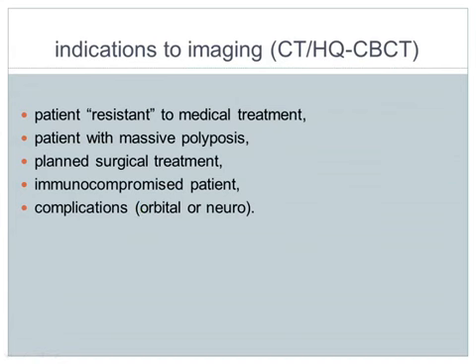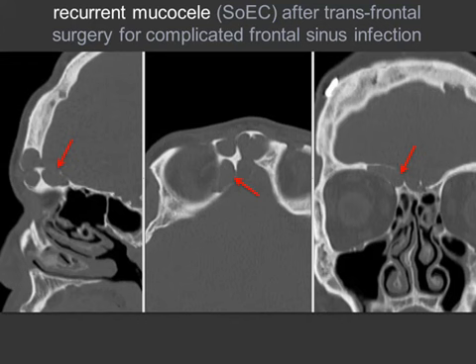And of course, it is very important in the immunocompromised patient, or when assessing the grade of complications like in acute rhinosinusitis. This is a patient who had already been treated because of a situation that at the end resulted in infection of the frontal sinus. As you can see, looking at the different profile in the frontal sinus and frontal bone of this patient, the approach was an infrequent one. It was not an endoscopic approach; in this case it was an open approach. You can also see the metallic finding over there. And the patient did not recover, but presented worsening of the symptoms.